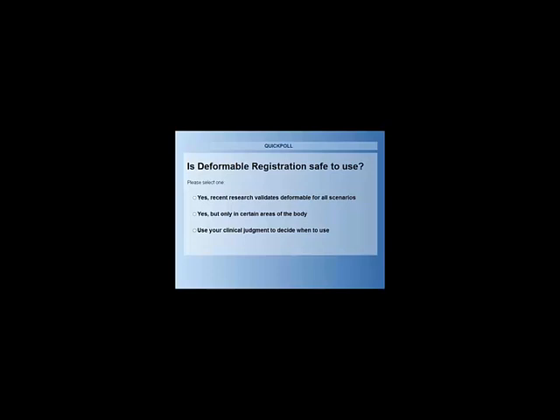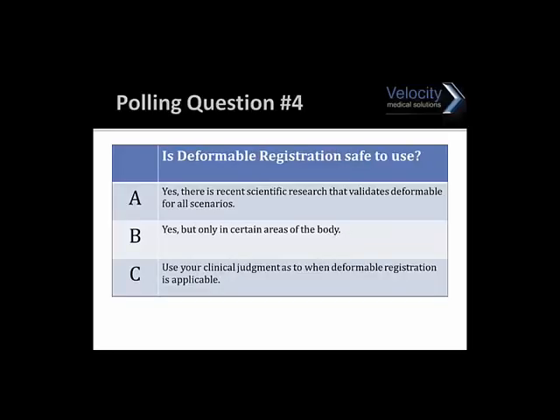And if possible, use whatever tools are available to you to assess the deformable results before you continue on, because PET fusion, structures, and deforming dose are all dependent on how well that CT deformation is done. So we'll kick it off to Yvette, and she can show us some more clinical cases using deformable registration.